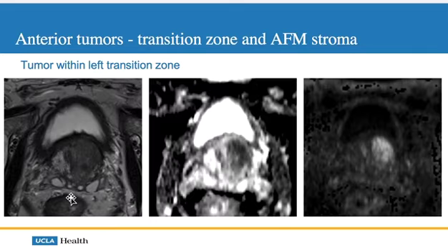Another example here. So this is a patient who had relatively substantial BPH. This is towards the base of the prostate gland. This is our T2 image here. You can see we're seeing the bladder, so we're near the base of the prostate gland. And if we were to look on sagittal, this is actually a lateral lobe that kind of grew up and was intravesical. And you can see here on T2 images this area of his lateral lobe has just kind of this sort of charcoal gray, smudgy appearance to it.